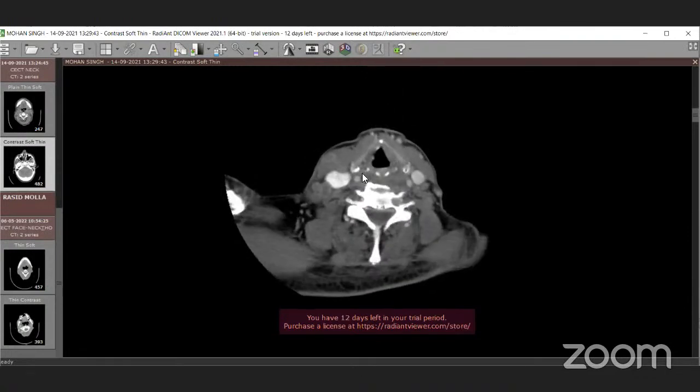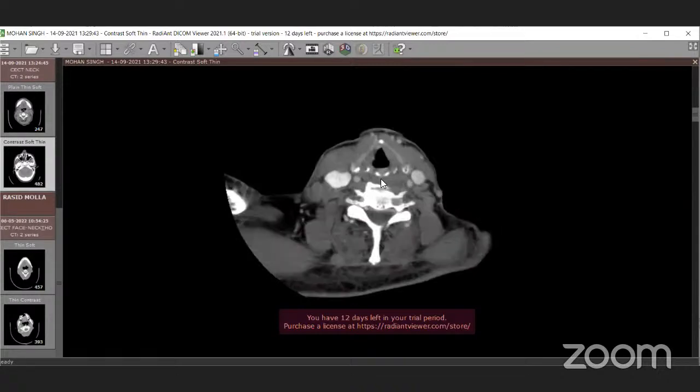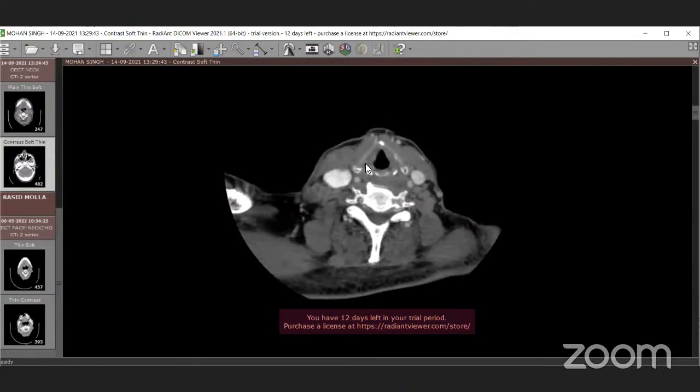And there is something called a thyroarytenoid gap, which I think we will deal with in the larynx. But since we are discussing, this is the arytenoid cartilage, this is the thyroid cartilage. There is a conduit of fat plane between the paraglottic fat and the hypopharynx. So any tumor in the pyriform apex can extend through this into the larynx, and a hypopharyngeal tumor, posterior hypopharyngeal wall tumor, also can extend through this conduit into the larynx.